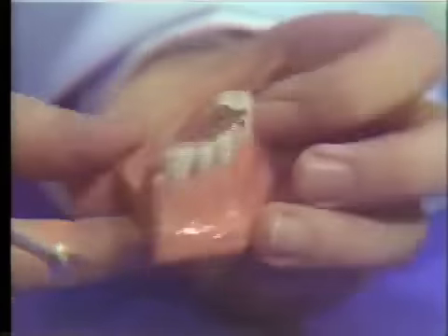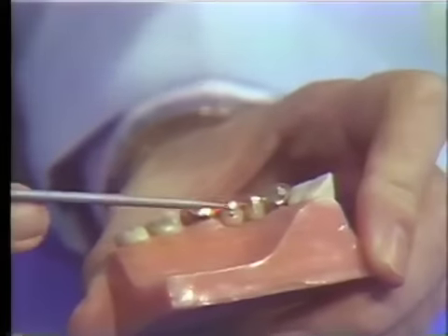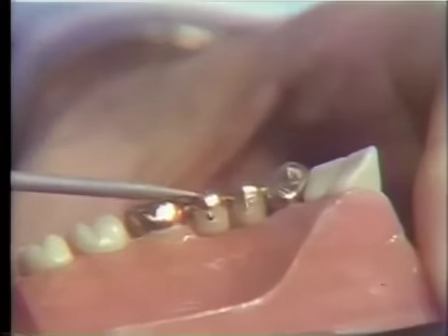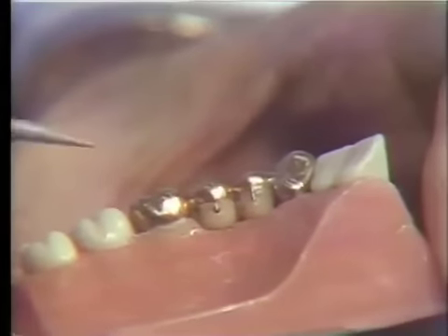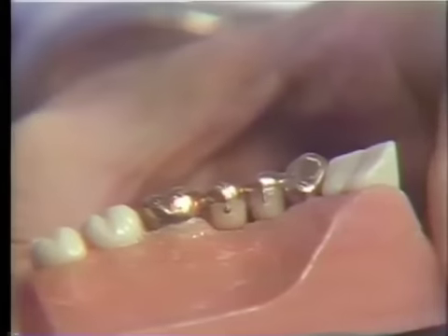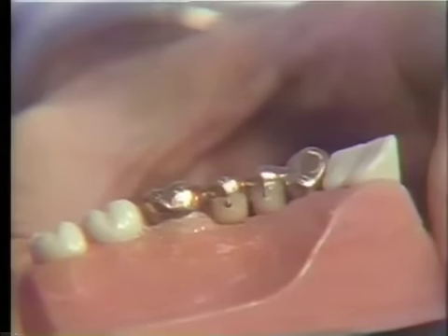And if I turn it around this way, you can see the lingual view of these, and you notice the same key type of situation that you get with the Steele's flatback. However, this key situation is out on the lingual surface and is in an area that can readily be cleansed. You can see here, I think, that you've got porcelain on the lingual surface, on the fitting surface, and on the proximal surfaces. And this has always been claimed as one of the great advantages of this Steele's true Pontic.